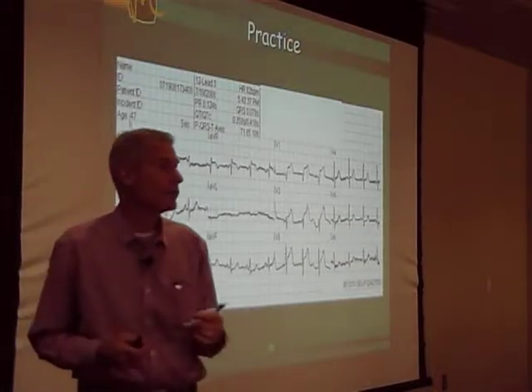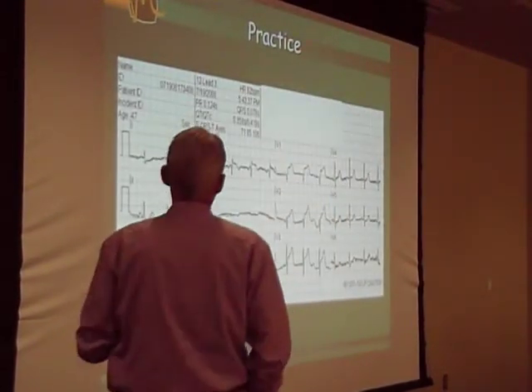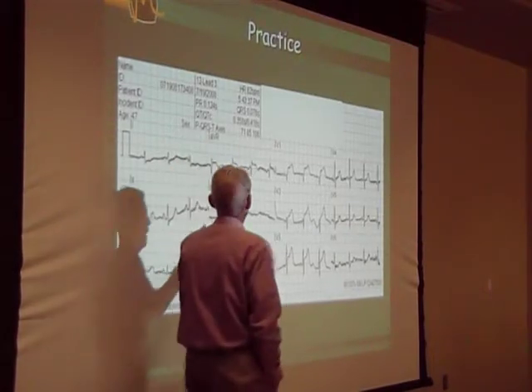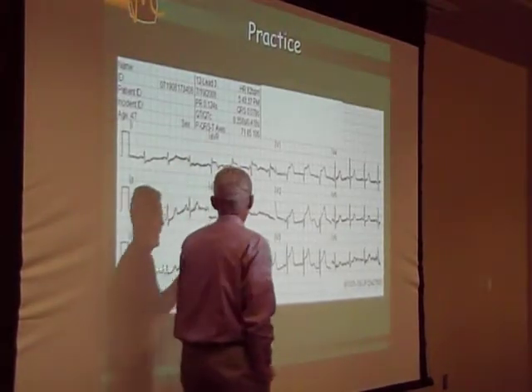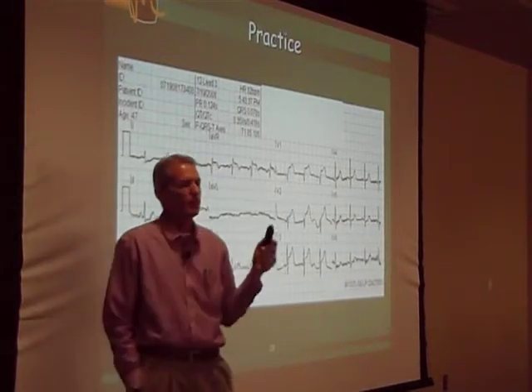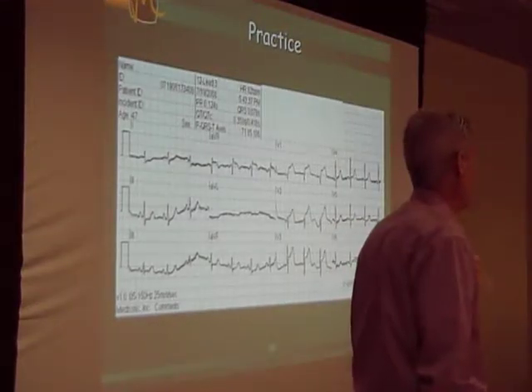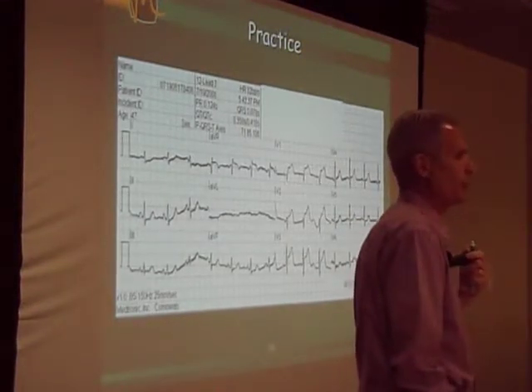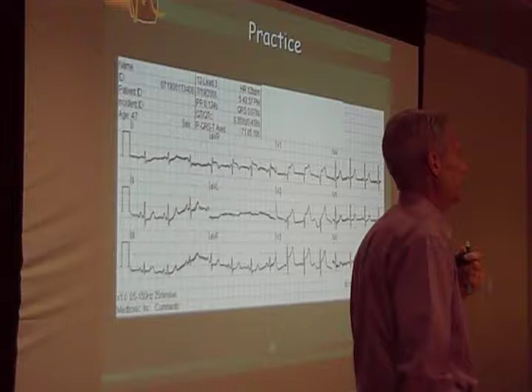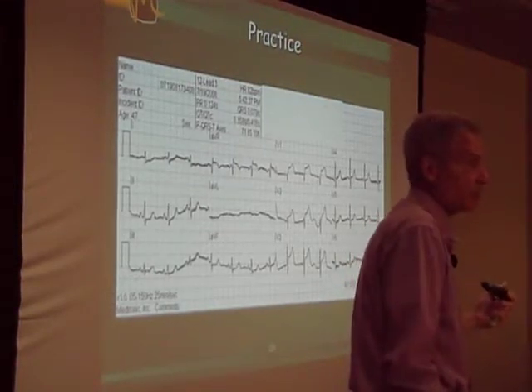First of all, we have somewhat of a messy EKG. Would you all agree? We've got a wandering baseline. It looks like we've got maybe some artifacts here that could come from muscle tremor. If this was creating a problem with your interpretation, you would redo it. Try and clean up the signal. Figure out where it's coming from. Do I have a TENS patient?